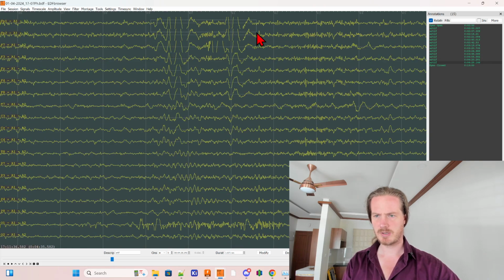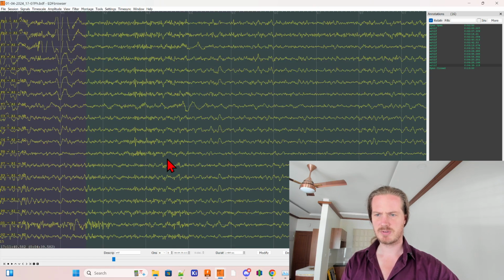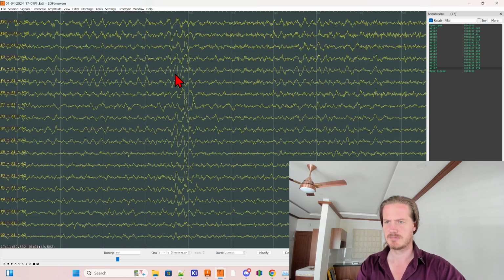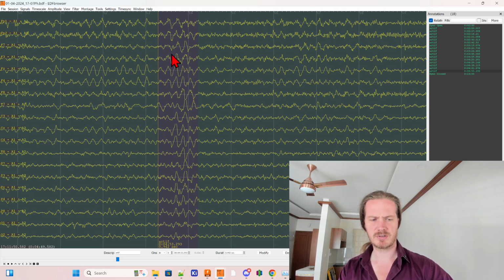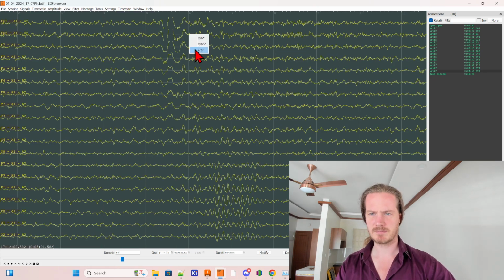And I'm going to mark these two eye blinks. Here we have a bit of noise. I'm pretty sure this is muscle activity, like a very minor clench of the jaw, so I'm going to mark it as well there. And this, whatever this is, doesn't strike me as... I'm not sure what this is, but I'm just going to remove it. I just want to have clean data that I'm very confident is clean.